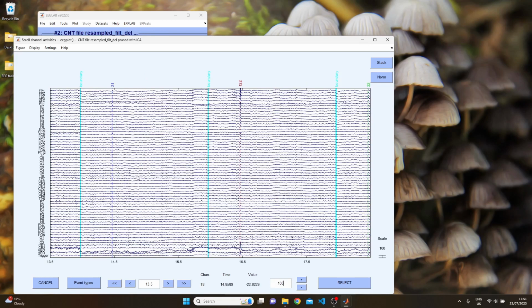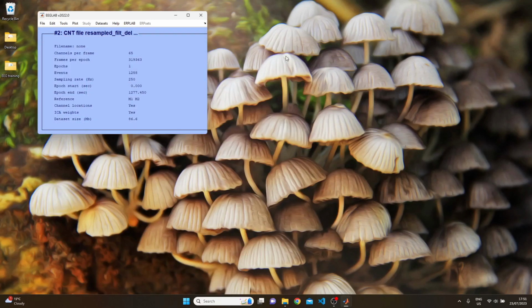It's important to note down the electrodes that you've interpolated for each dataset, as this is something that any good pre-processing section reports, and it's quite difficult to get this information back out of the dataset if you haven't noted it down at this point.